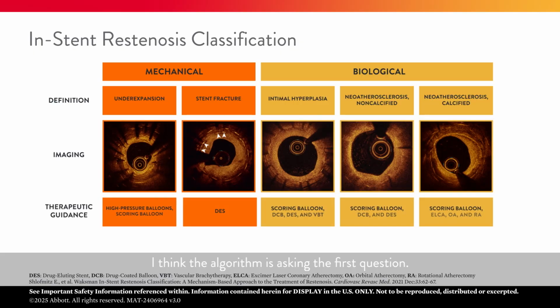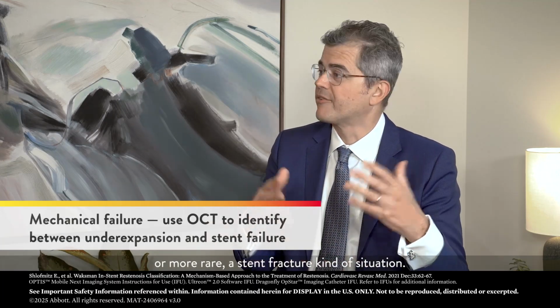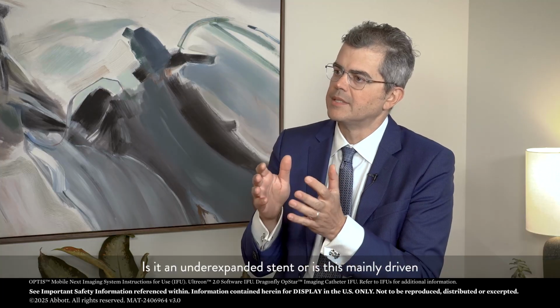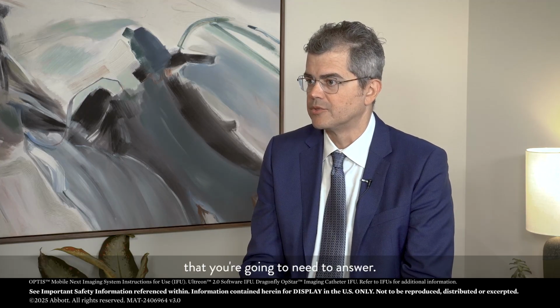I think the algorithm is asking the first question: is this a mechanical failure or is this a biological failure? That you can translate: is this stent originally underexpanded? That would be the mechanical failure, or more rare stent fracture kind of situation. But let's stick with the most common situation. Is it an underexpanded stent, or is this mainly driven by a lot of tissue proliferation? So that's the first question that you're gonna need to answer.